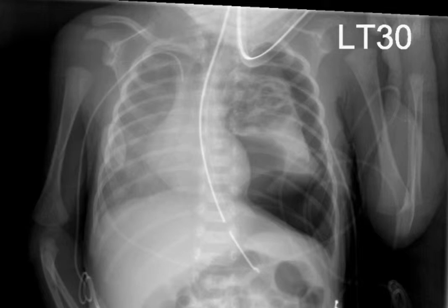And you can see there's coalescent areas of interstitial emphysema in the left upper lobe. The left lower lobe and the lingula are probably free of any interstitial air, but obviously at some point there was rupture across the visceral pleural surface, giving you the tension left pneumothorax.